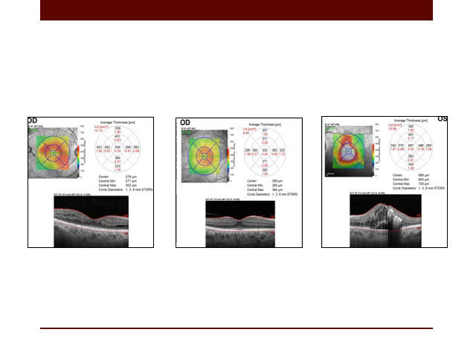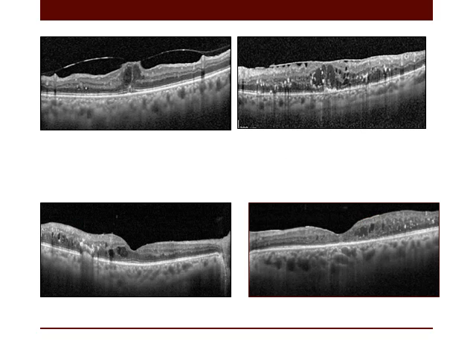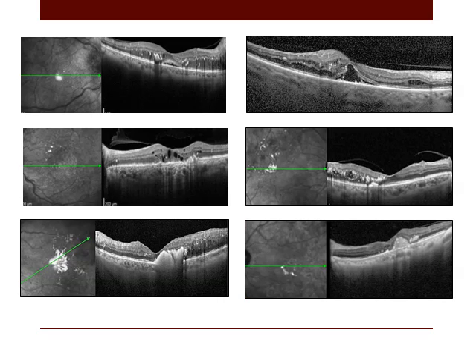Again, first factor is the type of thickening. Central sparing thickening carries better prognosis than central involving diffuse thickening, and lastly, central involving cystic thickening. The presence of vitreomacular interface abnormalities carries less favorable prognosis than in a patient without vitreomacular interface abnormality. Distortion of the macular layers: if you find interruption of the outer retinal layer, like in this patient, this carries poor prognosis, while a patient with intact outer retinal layer carries better prognosis. The presence of central serous elevation carries less favorable prognosis.